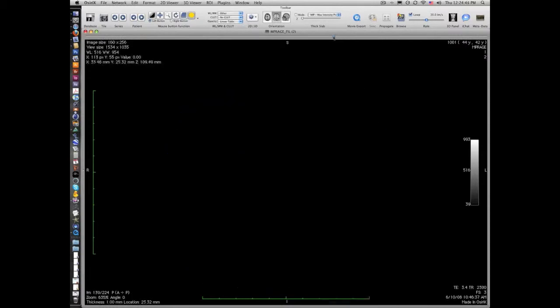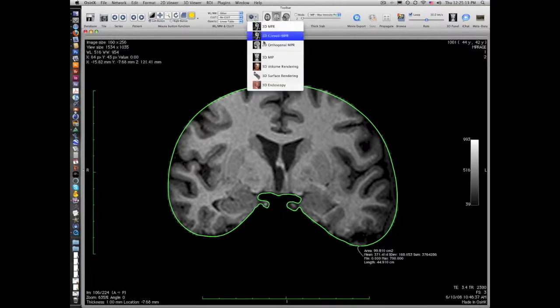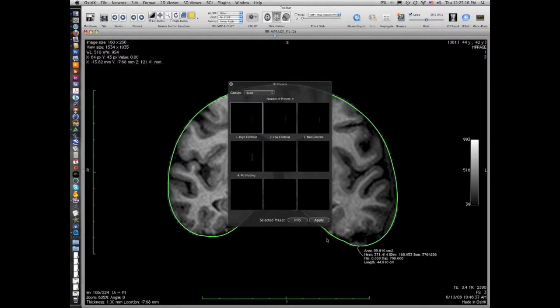Okay? Now, if we go through here and we scroll, only the slices that have ROIs will show any data, and it will just be the stuff inside the ROI on a particular slice. And that's useful because the brain might not start until around in here, so you don't have to trace ROIs on that slide. You wouldn't be tracing ROIs on there anyhow, and it just knows that all those are supposed to be completely black.